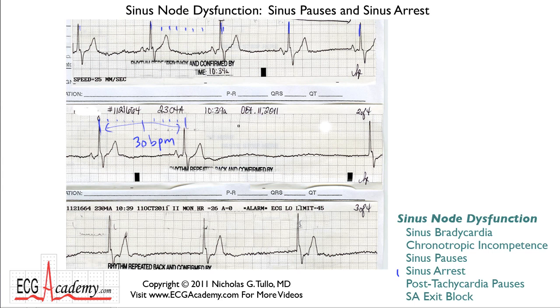And then look at this long pause. 1, 2, 3, 4, 5. 1, 2, 3, 4, 5. 1, 2, 3, 4, 5. 1, 2, 3, 4. Holy schmoly. It's more than 4 seconds. So we would call this sinus arrest.